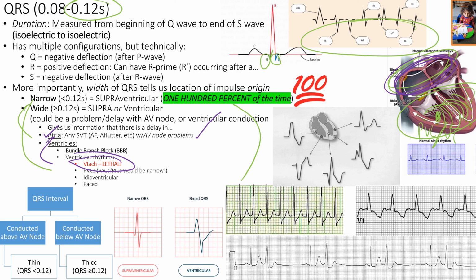Okay? All right, so that is the idea behind QRSs, P waves, PR intervals, all these things, right? And a lot of this came from physiology, so we're recapping a lot of things here. And then the next thing that you have to know about is what does that mean and what do I do about it? So what are the nurse interventions I do for this? Like get a 12 lead is usually the right answer, right? I'm going to get a 12 lead to figure out what exactly I am seeing, and assess their blood pressure, because if a rhythm is going off, it might be affecting the blood pressure.